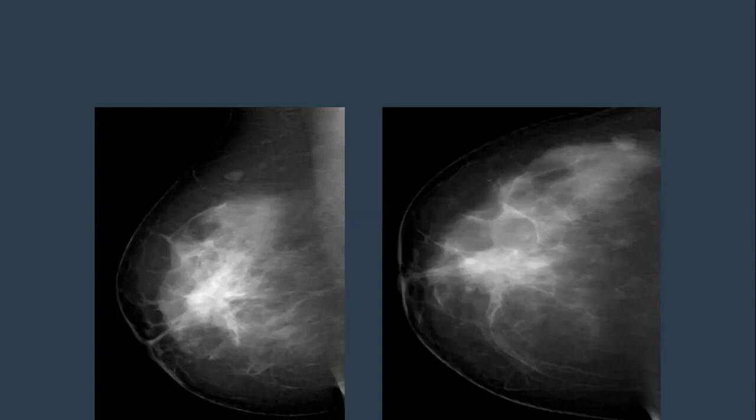So I will call it, as I described before, the focal added density. We call it a focal asymmetry. Yes, it is associated with focal asymmetry. There is an area of distortion associated with focal asymmetry and nipple retraction, or a subtle increase in skin thickening, periareolar skin thickening.